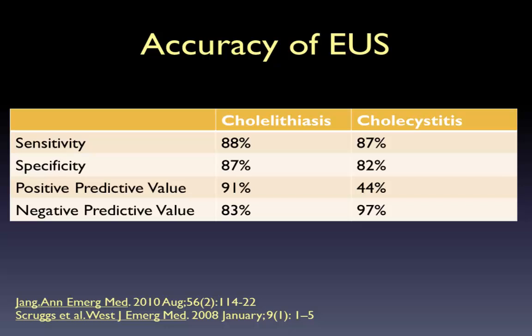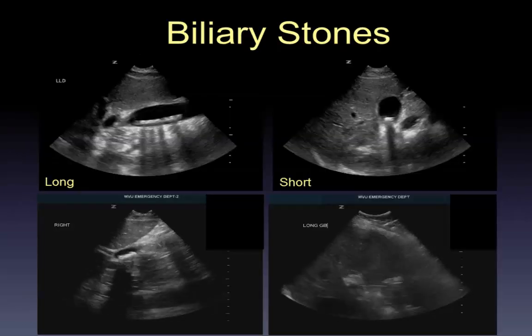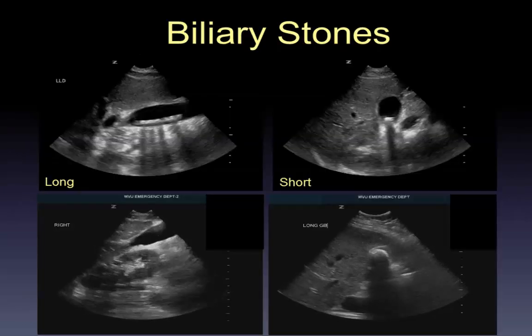Remember, even in the radiology lab with the best radiologists and sonographers in the world, sometimes even a great ultrasound can miss biliary tract disease or gallbladder dysfunction. Back into the pathology, just wanted to show you some more examples. I think the more you see, the better.